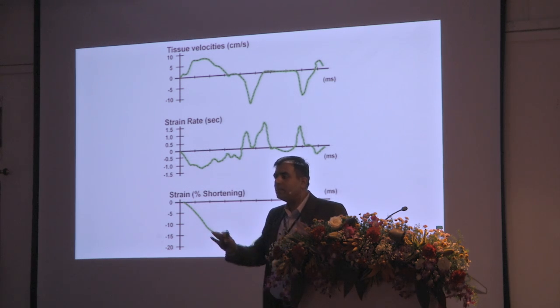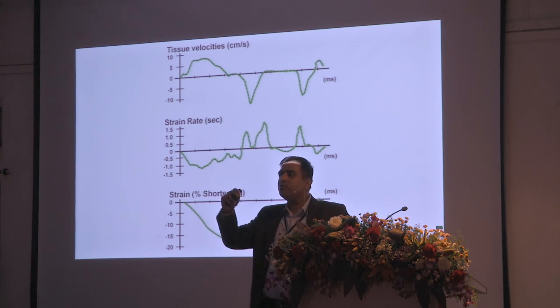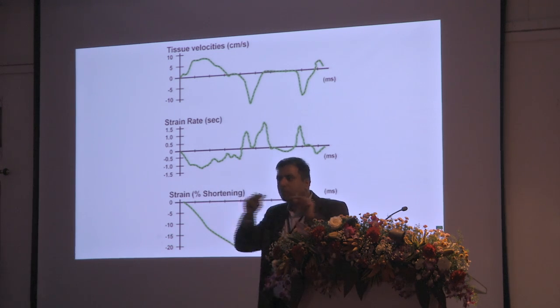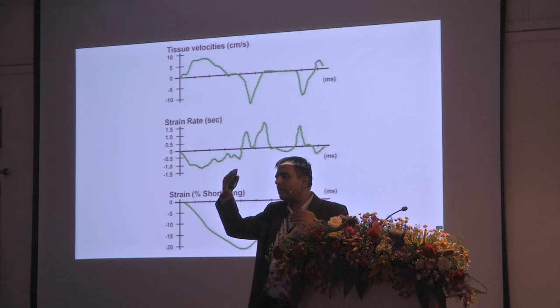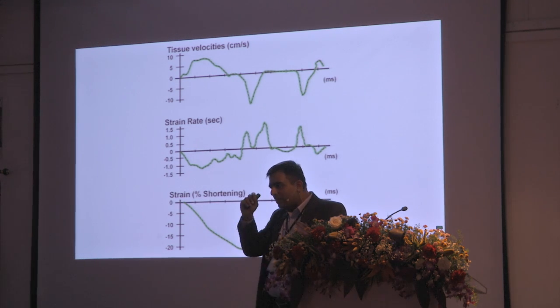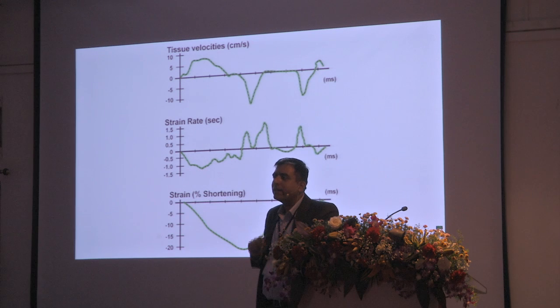No. The baseline is there, 0. You have to visually see where it is so that you keep in mind. I just want you to know where that 0 line is. Sometimes it's very confusing. It's not marked separately with red. You don't need to mark it, but you need to know visually where it is.